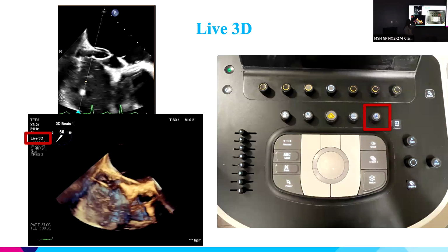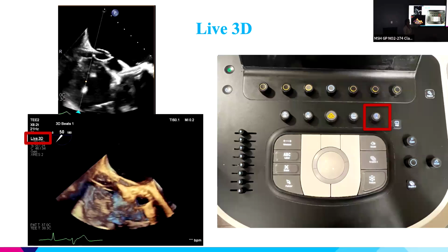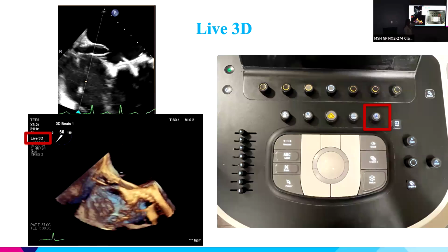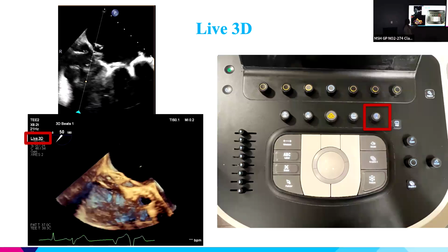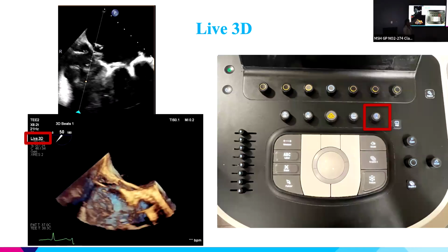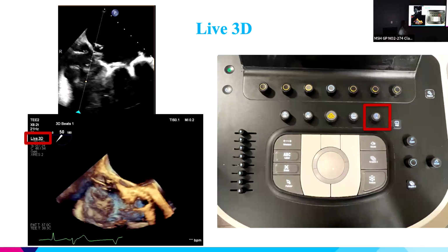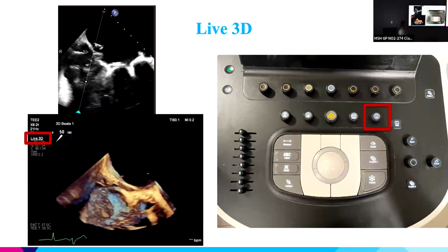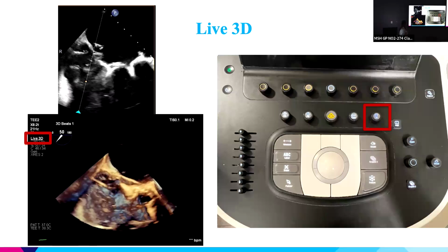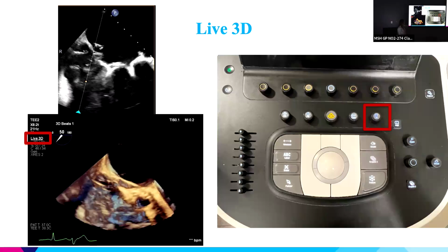So if you say, oh, I have the aortic valve in here, let me just measure an aortic valve area, you can't, it's cropped out. You can't measure a mitral valve area, or a tricuspid valve, anything, because it's only this little sector of 3D that you got. That's one of the reasons why the image quality is so clear, because it's such a narrow elevation width. But any 3D image you see will be labeled on the screen with what it is.